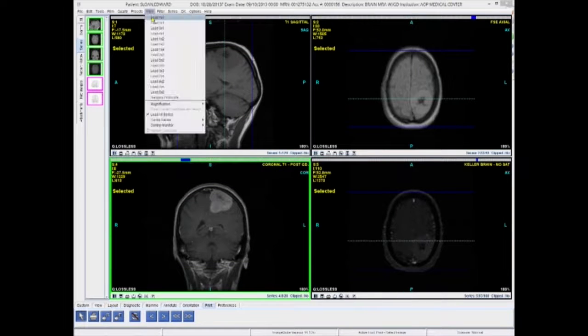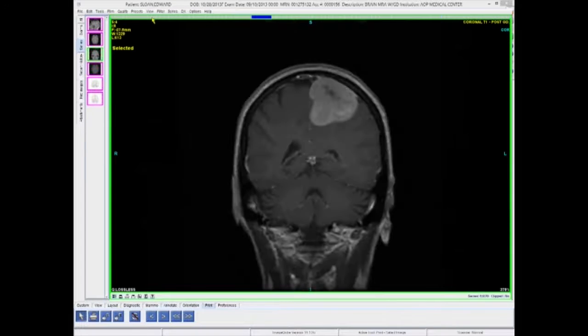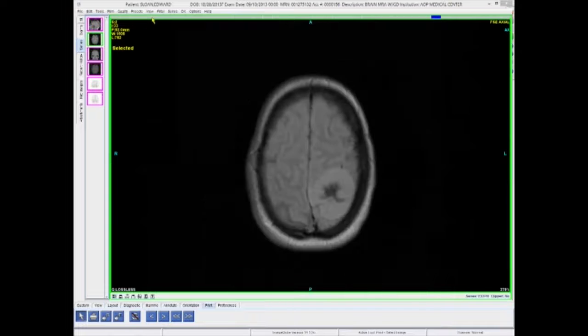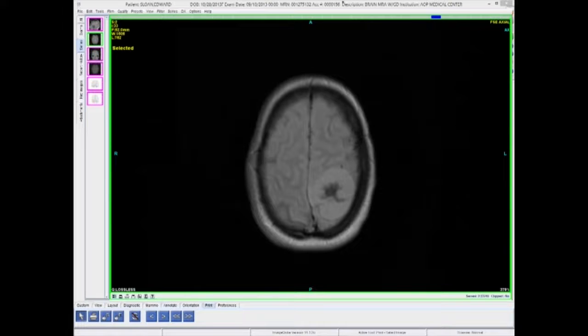A one-by-one view of this study shows as the left and right arrows are selected; only the selected images are viewed. When the exam is exited and relaunched, those images will then still be available.